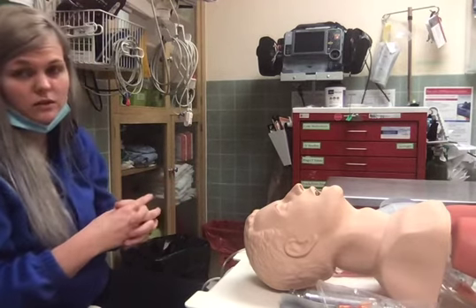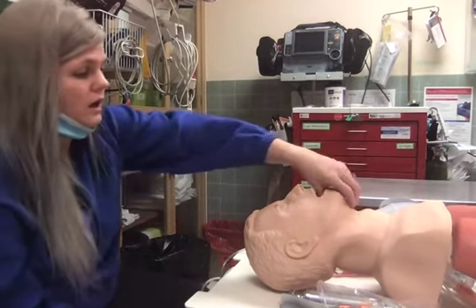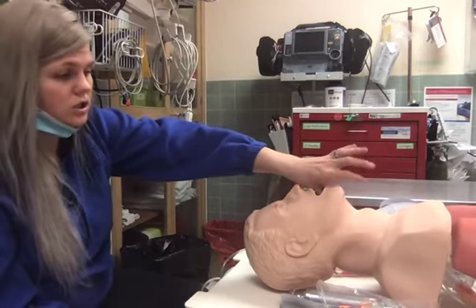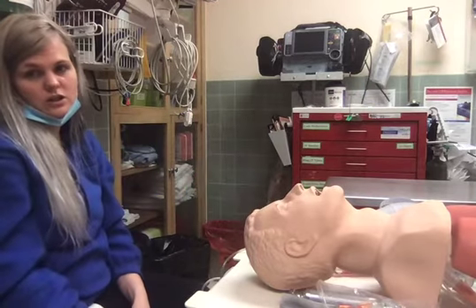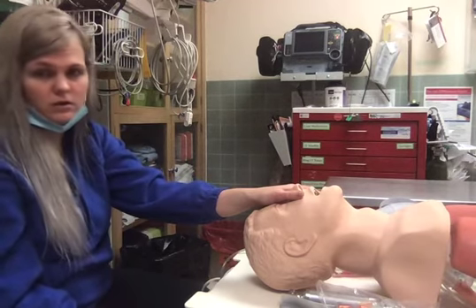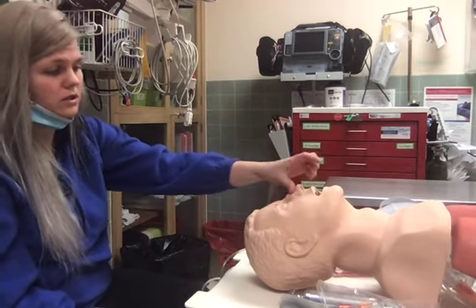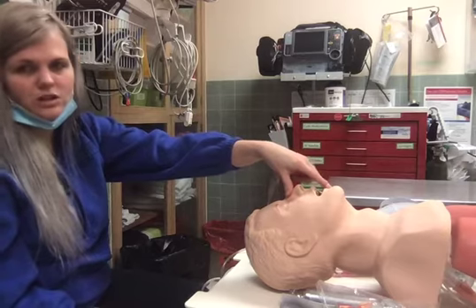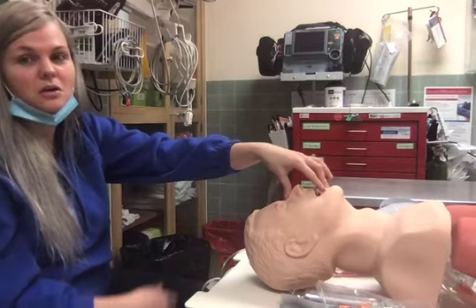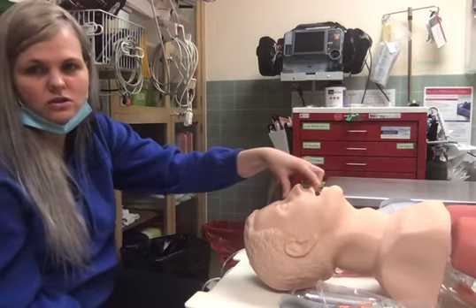Starting values as far as the Trilogy are 6 and 16. So 6 for your exhalation and 16 for your inhalation. And then you're going to titrate your FiO2 based upon the oxygenation needs of your patient. Again, same method as CPAP. Those are very secure masks. They are actually sized from the bridge of their nose to the bottom of their lip to their chin. Sometimes they don't have much space there. A lot of people will just look at the patient and say, oh, that's a big guy, we need a large. No, that's not the case. And then you'll have an ill-fitting mask, which will cause a lot of issues as you go.